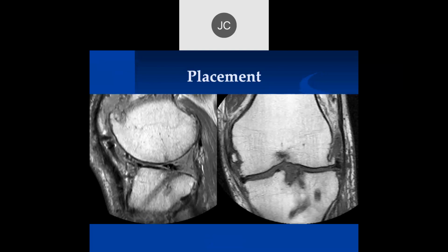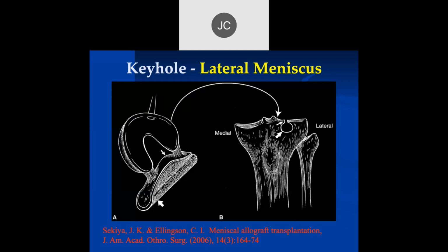And here's abnormal placement. The anterior horn's not too bad, but it's a little anterior. The posterior horn is way too far anterior. The tunnel is too anterior, and the tunnel is too anterior here. So that's not good placement.